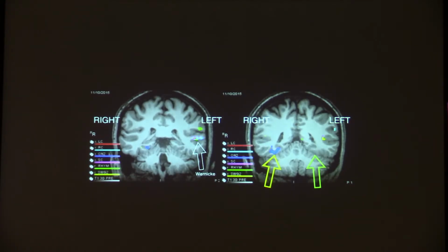So because there was a lesion in the fusiform gyrus, we specifically did a test called an object naming task. We show them pictures of things, and they're supposed to tell us what it is. And that's exactly what the fusiform gyrus is supposed to do. I mean, we didn't do face pictures, but at least we got the majority of what the fusiform gyrus is supposed to do. And it just beautifully showed that every activation for the fusiform gyrus was on the contralateral side.